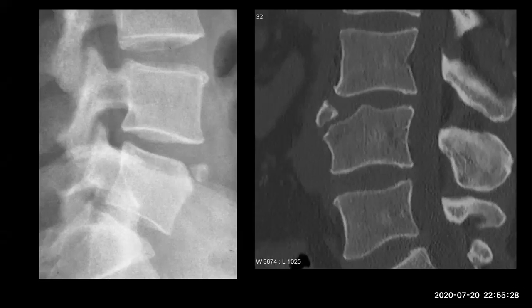What about the infection? Here, 2 patients, by the way, not 1 patient. The other differential is infection, but with infection we see some bone destruction. The disc is maintained, and also the soft tissue around the anterior infected part.